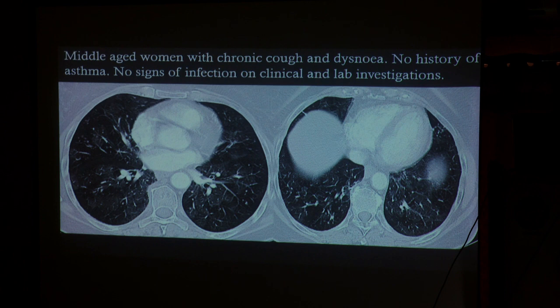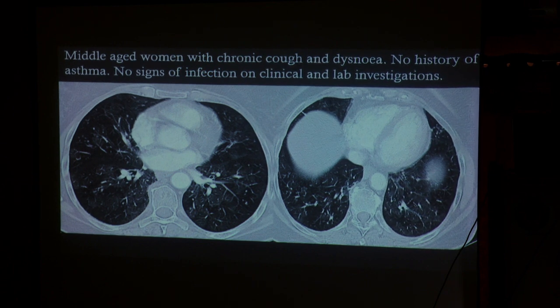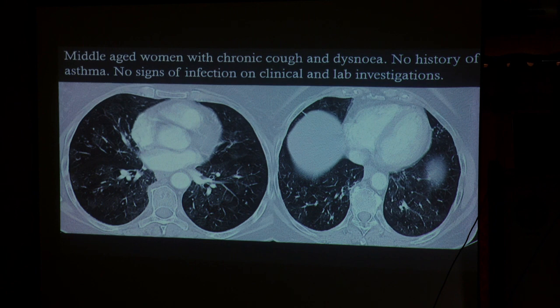Then we have small airway disease. So how do you figure out small airway disease? Take an expiratory CT and confirm with the air trapping, and then you go with small airway disease. Then any other differential? Constrictive bronchiolitis, where you have bronchial thickening and nodules, due to which you see hypoattenuation. So if I give you another clue, that is it is a pre-neoplastic condition, which you are seeing here.